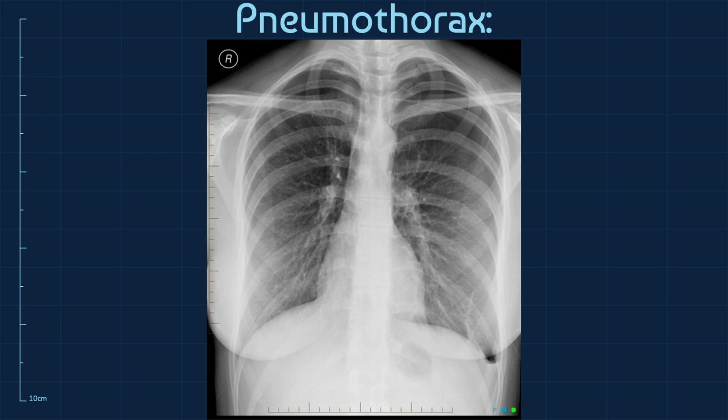And I know we more or less discussed this previously when talking about tracheal deviation, but when it comes to determining pneumothorax, it usually falls under the breathing section of your ABCDEs. And I want you guys to pause the video and try to determine which side the pneumothorax is on. And once you've done that, I can tell you that the pneumothorax is in the upper zone of the left lung. And I know this because I can see that thin solid white line we discussed, which is the pleura of the lungs, and I know that there's absence of pulmonary vasculature extending beyond that line. So I know that this area is all filled with air and it extends all the way to here, and that this patient has a pneumothorax.